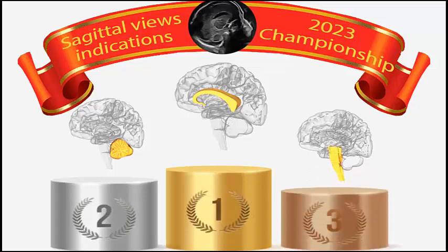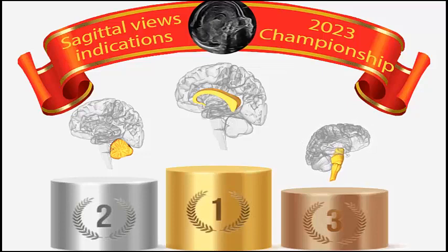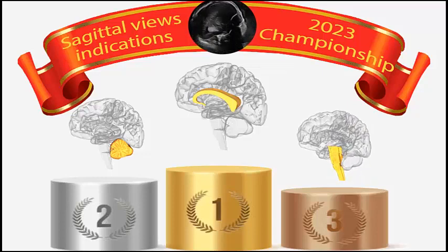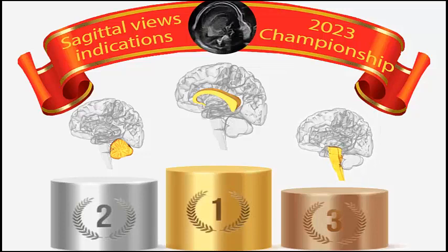And the third issue in which the sagittal planes are essential is the visualization and assessment of the midbrain and brainstem. Of course, in the context not of a routine exam, but of a neurosonography.